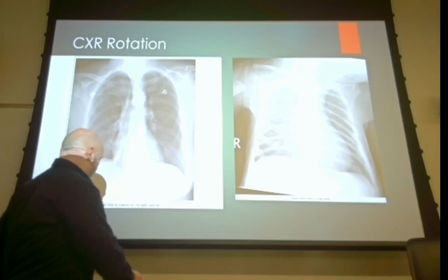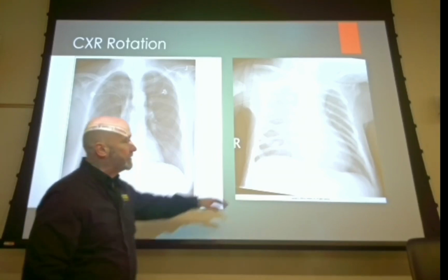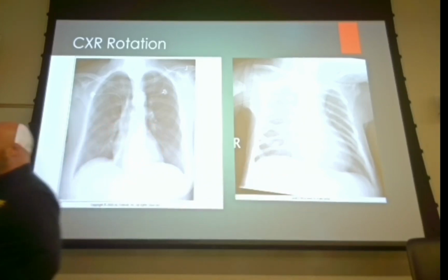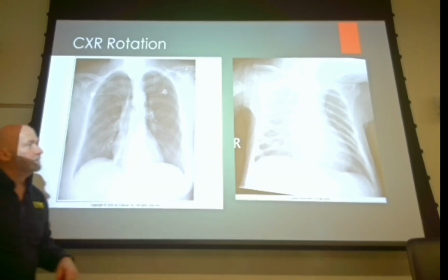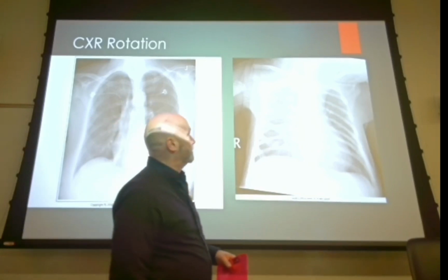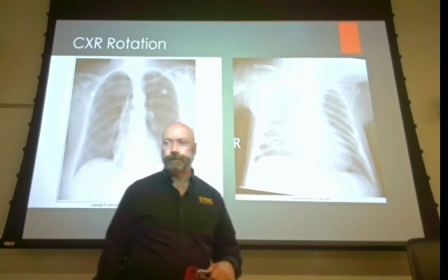So, put yourself into this guy's shoes. That patient, how old do you suppose that patient is? Two, maybe? A little bitty one, right?